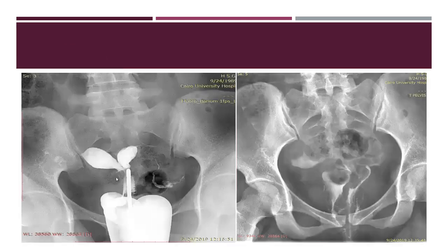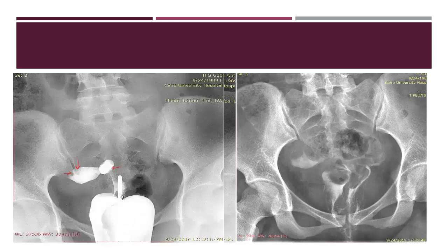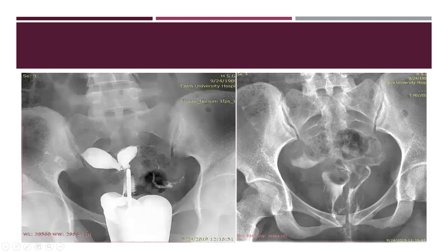In this case, it looks like septate because it is an acute angle, but this is a duplicated cavity. This is the plica palmata of the cervix, which is normal, and this is the duplicated uterine cavity. But take care, and this is the control film. There is homogeneous smearing of the peritoneal folds. This contrast is in the vagina, it's nothing. It is corrugated in appearance. This is the vaginal smearing after the procedure.